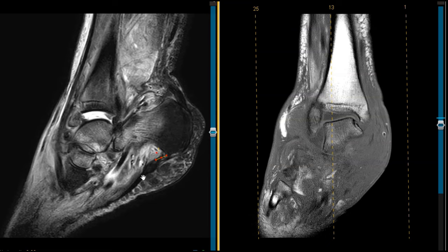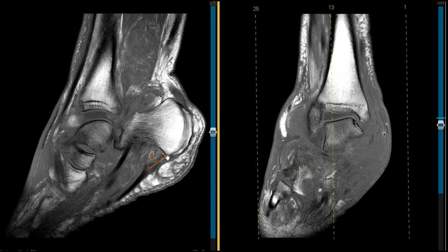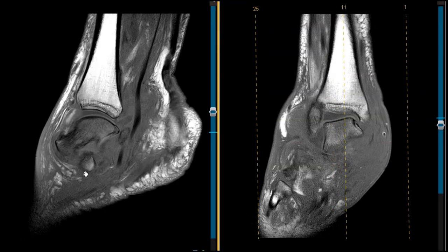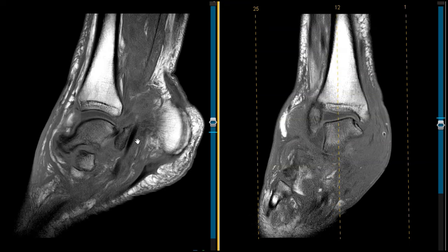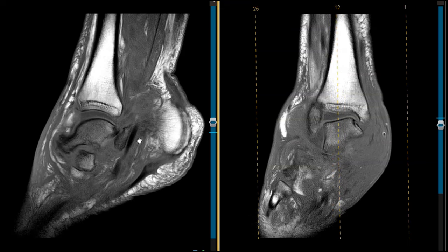This is the patient's plantar fascia. It's partially torn and attenuated here where it attaches to the calcaneus. So lots of findings, but the main finding really is this dislocated, rotated navicular bone and lots of marrow edema throughout here. So when we see findings this striking and the patient has really no clinical symptoms, it's almost always Charcot foot, which is diabetic neuropathy.